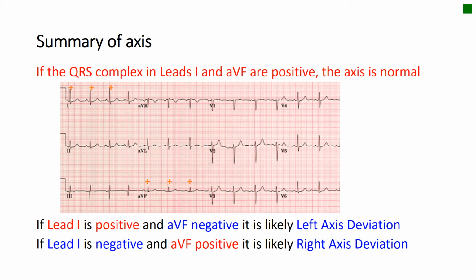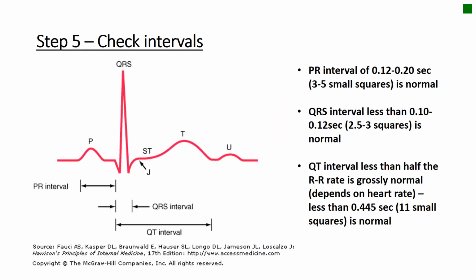Now, I'm not expecting you to know this, but it's just to give you information and to inform you how the steps of looking at an ECG are. And now we're going to move on to step 5, which is checking intervals.